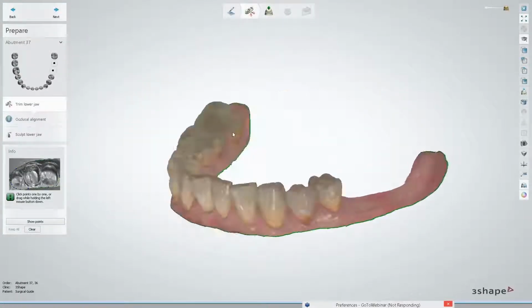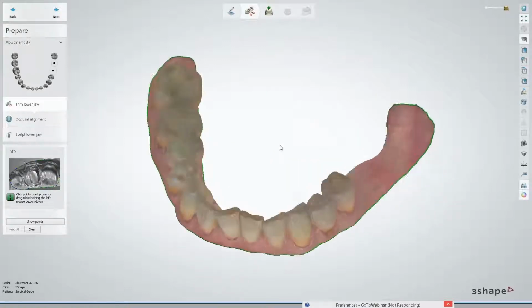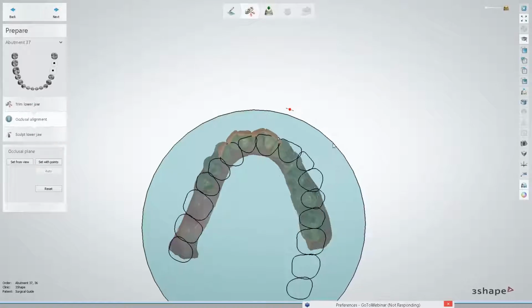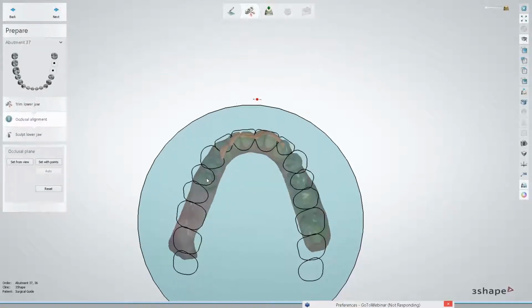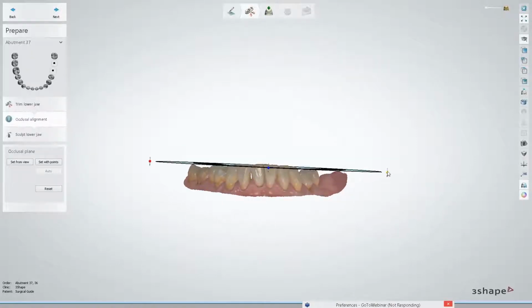As you can see, scan is here, it's correct. I also should have annotations in here. They will be shown later on. If I don't need to trim anything, this scan looks particularly clean, then I'm not going to make any changes. If I change the position of the template in here, that would mean, and it will be very relevant, if we are going to send the case later on for printing, for model.